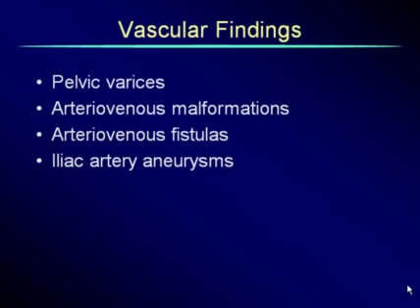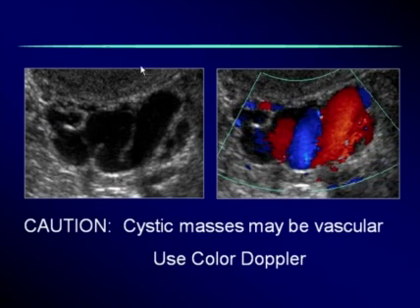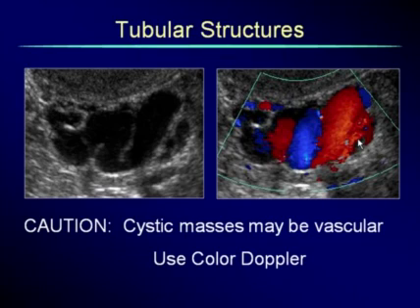We're prepared for it. There are vascular etiologies that we see in the pelvis. I'd like to talk about some of these. In the pelvis, when we see fluid-filled tubular structures, we would usually think of hydrosalpinx. But I do strongly recommend that when you see a tortuous tubular structure filled with fluid in the pelvis, turn on the color Doppler, because it's very possible that this could be a vein. If it has peristalsis, it's bowel loops, but if it has blood flow, then it's a vascular structure, so we have to keep those 3 things in mind.